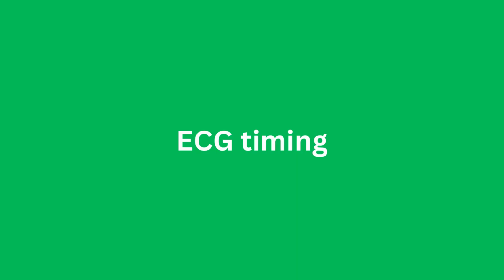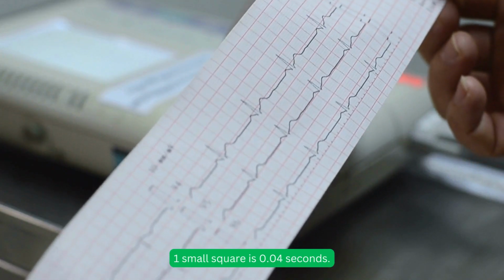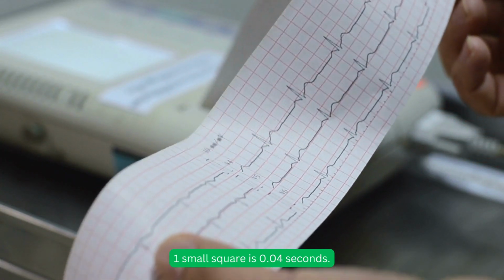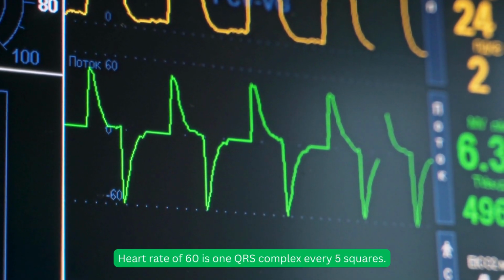ECG timing. 5 large squares per second, 300 large squares per minute. So 1 large square is 0.2 seconds. 1 small square is 0.04 seconds. A heart rate of 60 is 1 QRS complex every 5 large squares.